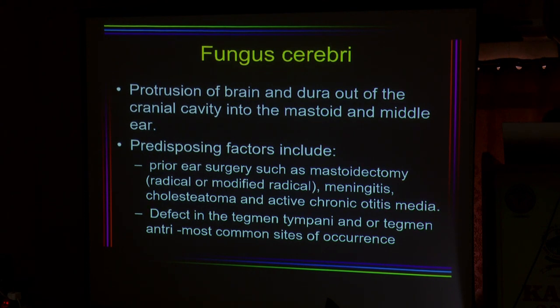So fungus cerebri by definition is the protrusion of the brain and the dura from the cranial cavity into the mastoid and middle ear.